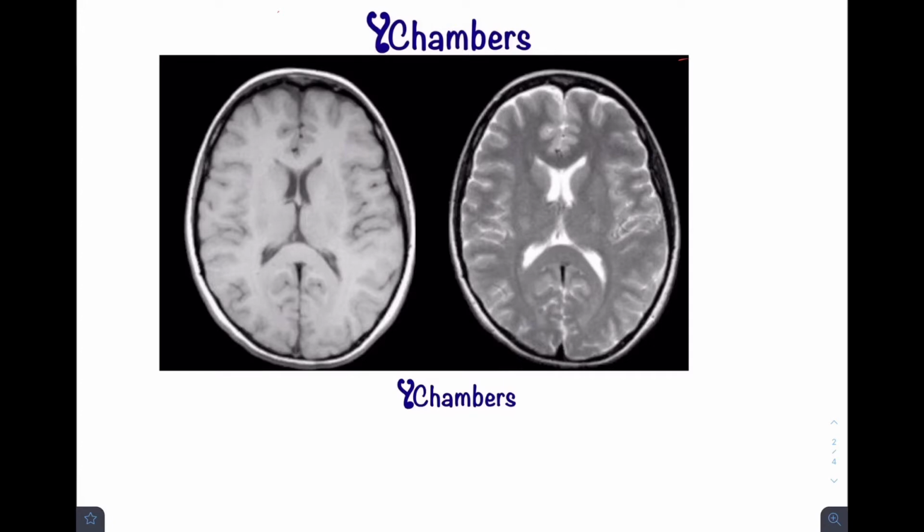So, in front of you on your screens are the two MRIs, this is a T1 weight and this is a T2 weight MRI. This T1 weight MRI is also known as the spin lattice relaxation time, while T2 weight MRI is also known as the spin spin relaxation. So you have two sequences in front of you, one is the T1 weight and another one is the T2 weight. So what is the major difference that you are able to appreciate?